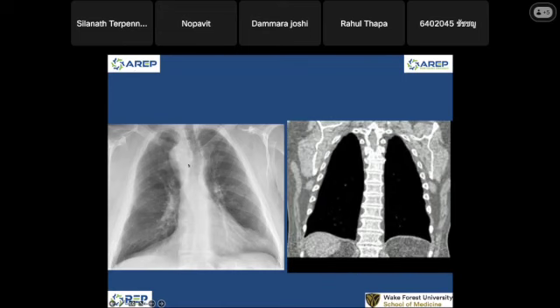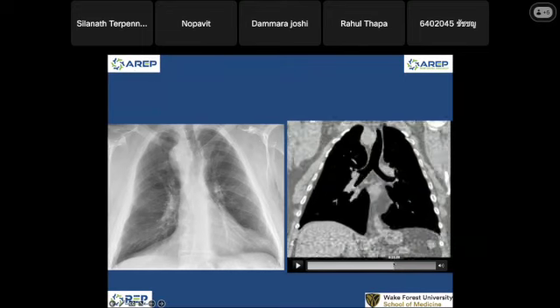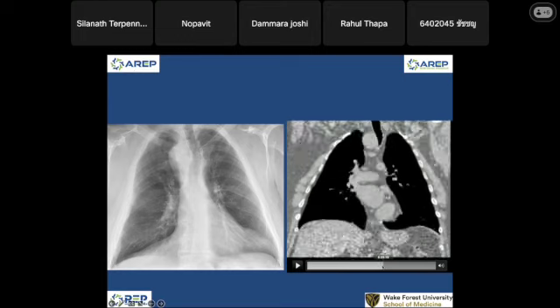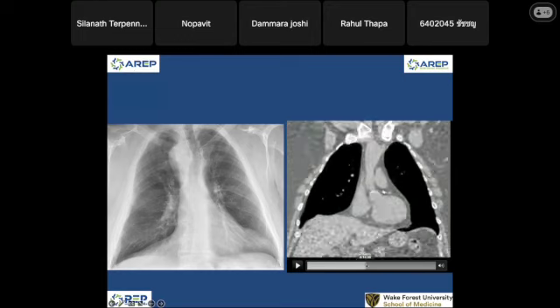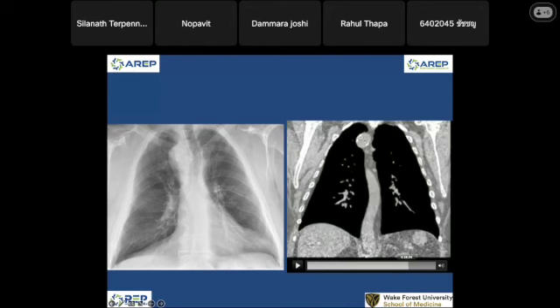This is the mediastinal mass. And this mediastinal mass is pushing the aorta to the left. If you look at it again, this is the aorta that was pushed to the left. And this is the thing that we think is a mediastinal mass. And actually, is it really a mediastinal mass here? What structure is that? This guy. Thymus.